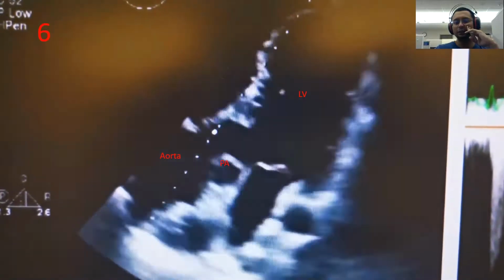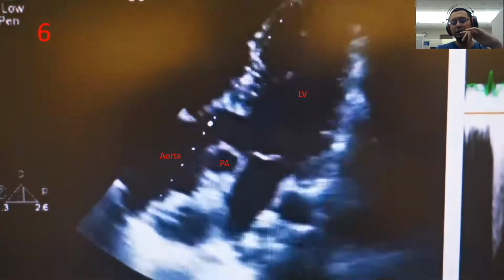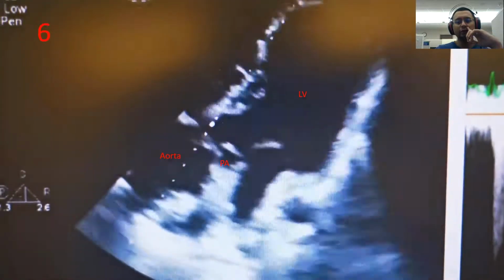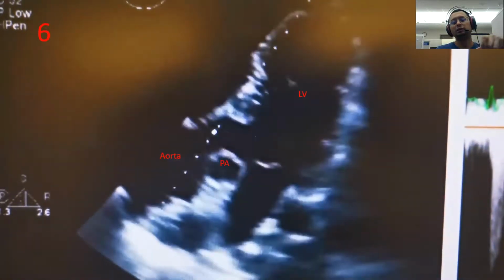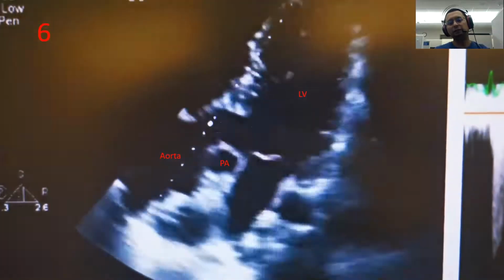It must be accompanied by ECG changes, right? No, the ECG is not necessary. The problem is that the epsilon wave, even though it is specific, is not sensitive. A lot of patients with ARVC don't have an epsilon wave in the ECG. Okay, all right.